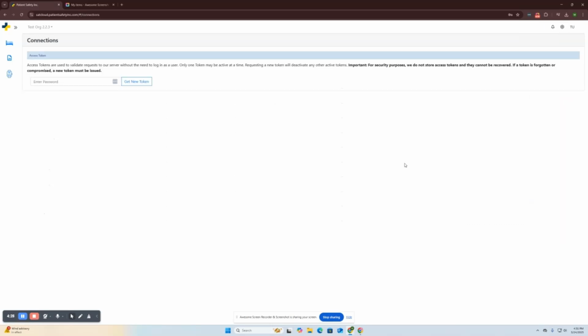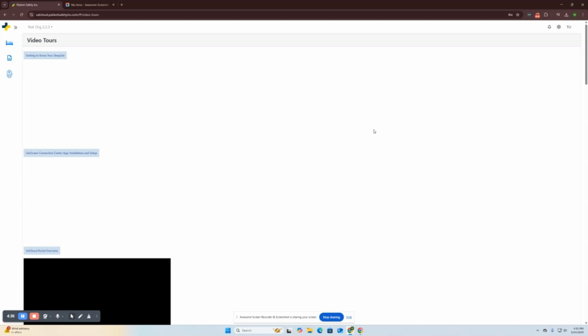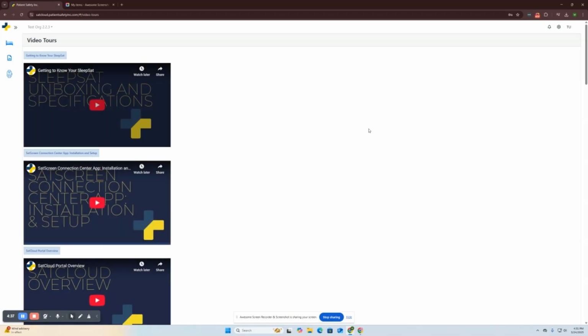Connections is only applicable to our users who use Daphne or have integrated another external system to work with SatCloud. And then all video tours are just direct links to any of our videos that you can also find on our YouTube channel. These are about our device and also SatCloud as well.